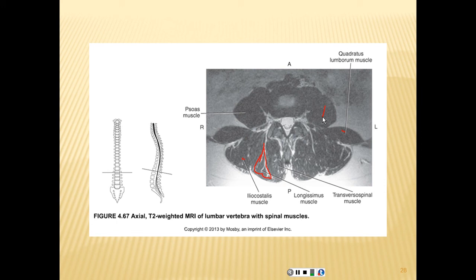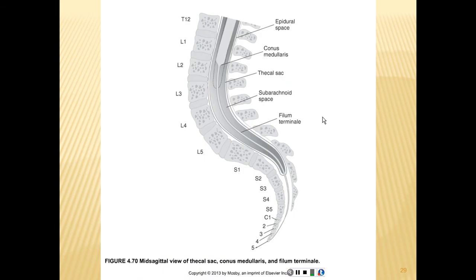Two important muscles to identify, because they can have hemorrhage or abscess formation in them. So you want to be competent to understand that the muscle is pathologic, so you can bring it to the doctor's attention immediately. Page 211 here, you see the conus medullaris, the very bottom piece of the spinal cord, the last piece of spinal cord that is going to have nerve bodies. The rest of the spinal cord inferior to that level will have axons.